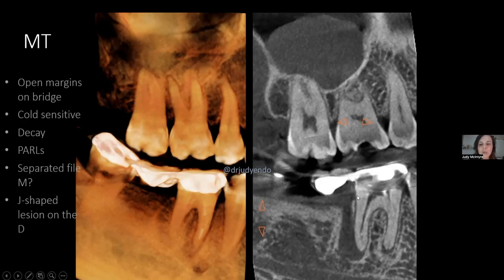Now, if this tooth were cracked, this spicule of bone, as I've shown you with all of the angular defects, would be the first thing to go, actually, because the crack would propagate coronally, apically, and this bone would be gone. This is primary endo, secondary perio. This is essentially an apical lucency that has found the quickest way out is through the crestal bone.